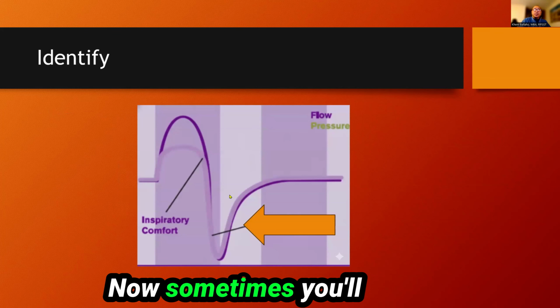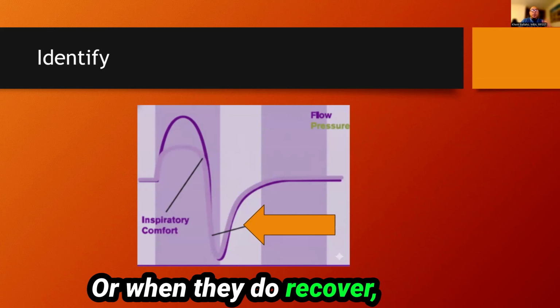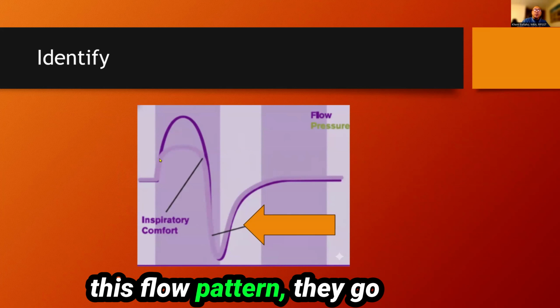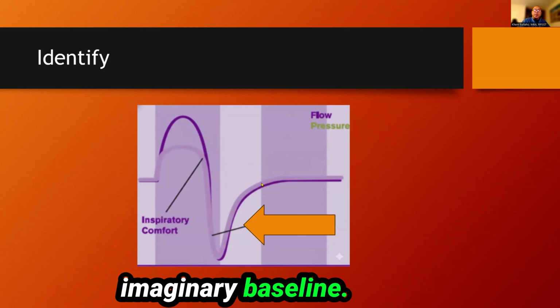Now, sometimes you'll see flow patterns that go way beyond the normal flow pattern when they recover. What is this typically when you see this flow pattern? They go way beyond the baseline. So the baseline is here, you have an imaginary baseline.